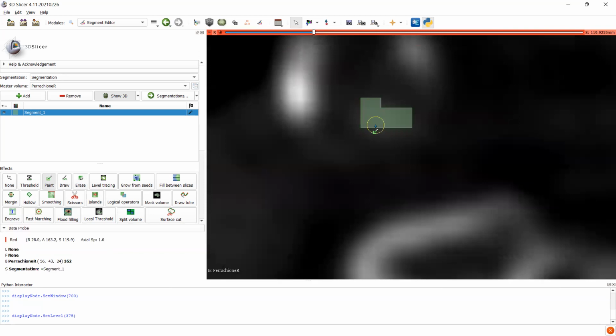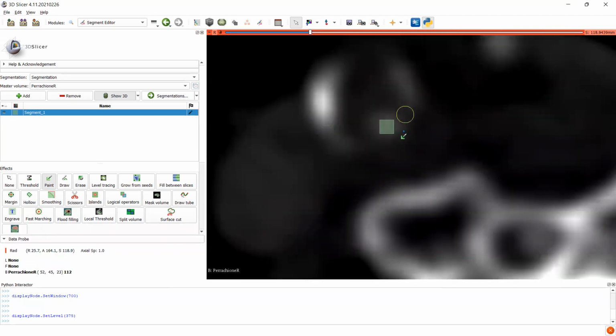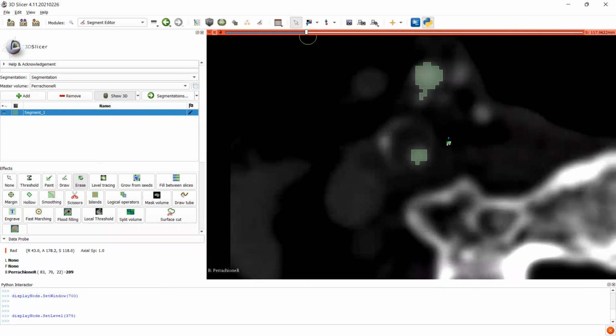I'm going to give this one the benefit of the doubt, almost as if to compensate for the other flow channel that we can't include. Same in this slide. So you're getting kind of the right total surface area when you add them together.